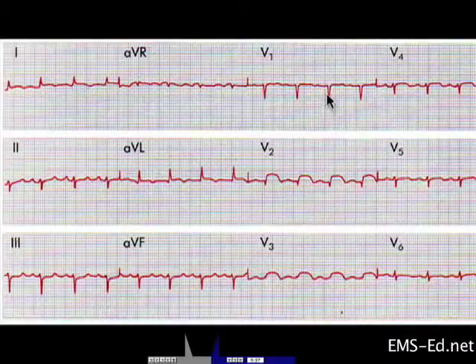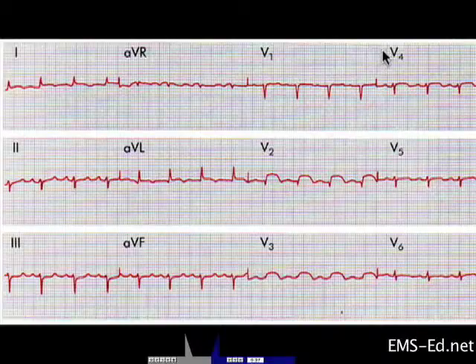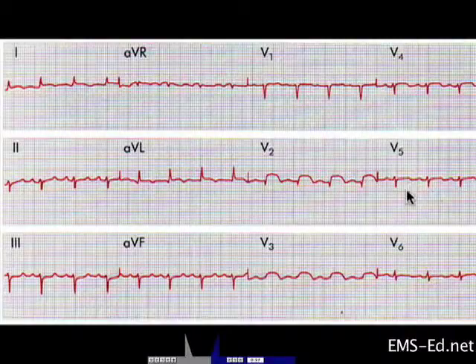We should consider the transition from a mostly down to a mostly up QRS complex in the precordial leads. Usually it occurs between V3 and V4. In this EKG, it is delayed since it is between V5 and V6. So there's nothing to suggest right ventricular hypertrophy.